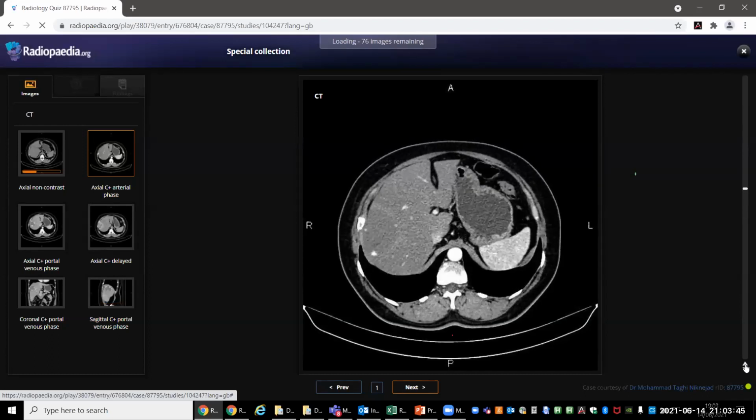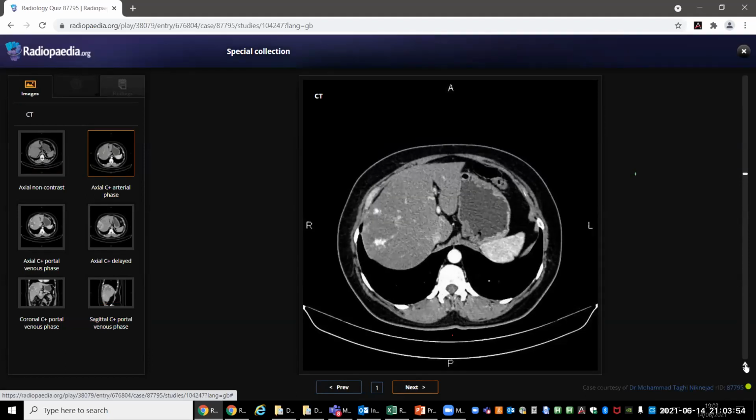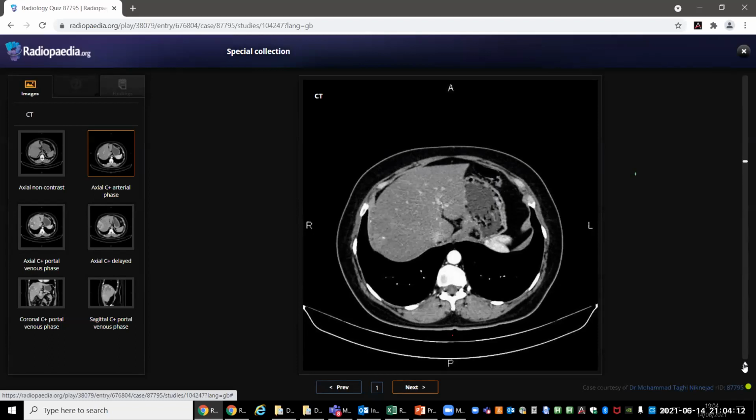Yeah, I think there is some low density rounded lesion in the periphery of the right lobe, maybe segment 7, with hyperdense density surrounding this lesion. Either it is calcification or contrast. Yeah, it is contrast enhanced. So this is a tubular or nodular enhancing lesion peripherally. I would like to see the delayed images just to be sure if it is hemangioma, because hemangioma enhances from peripherally to inside. Okay. So can I go to any?